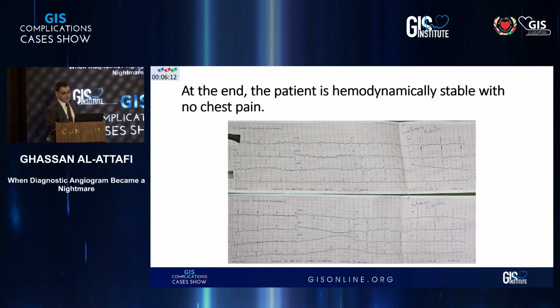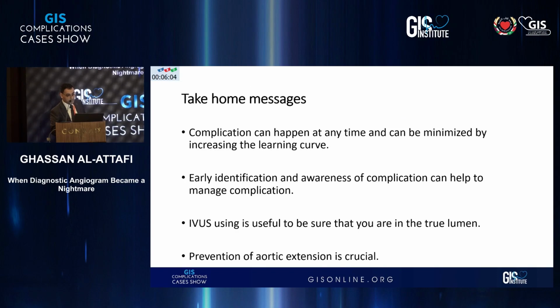I think this is the ECG. The first one is before the procedure, and the second one is after the procedure. It looks normal without any residual changes. I think my presentation is a little bit parallel with the presentation of my colleague, Dr. Aram, in that we can face complications with diagnostic procedures.